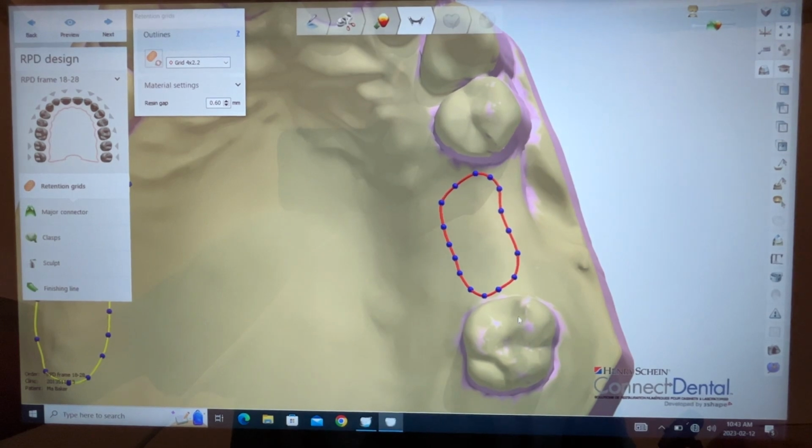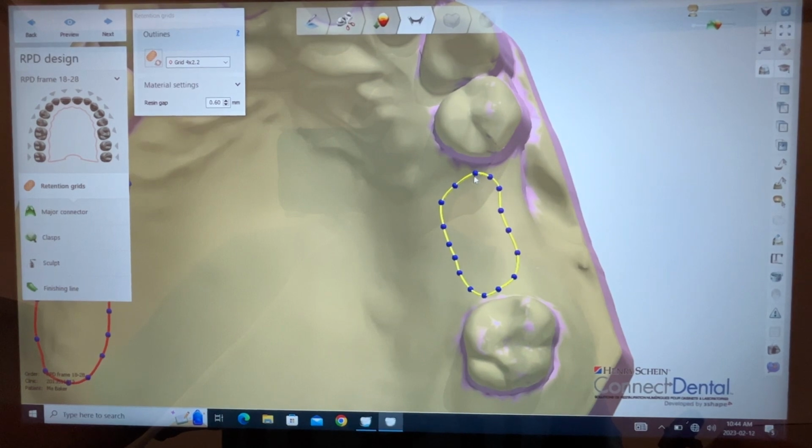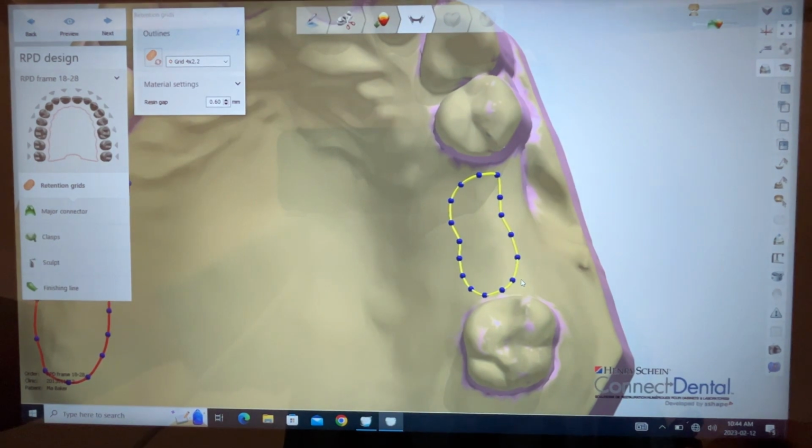Let's zoom up. So here you can design your shoe extensions if you wish. I mean, there is a lot of freedom here. And I think 3Shape is intuitive. Intuitive is the right word? It's been designed by computer programmers at the direction of dental technicians. Say, can you get it to do this? And they'll say, yeah, let's go back to the computer programming lab and I'll get it to do this. I don't think they're dental technicians themselves, and they need our input. And I think it's come a long way. People have given a lot of inputs.